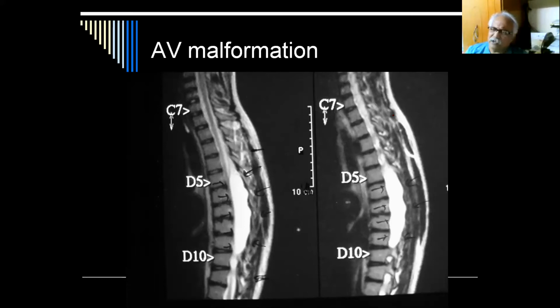Even in multiple myeloma, the picture in the MRI will be different. So these are the 5-6 common things that you have to see in your MRI of the spine. I am not going into very much detail in telling you the spinal MRI, because beyond these 6-7 aspects, you will never be asked in your exam in any way. If you can diagnose these 5-6 things, I can tell you, you will score 10 out of 10.